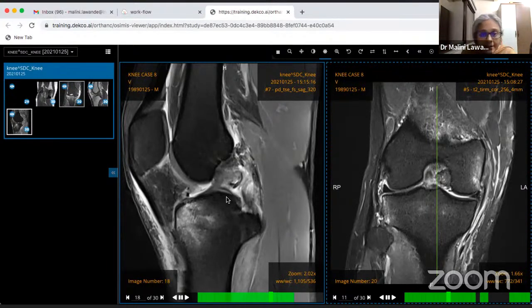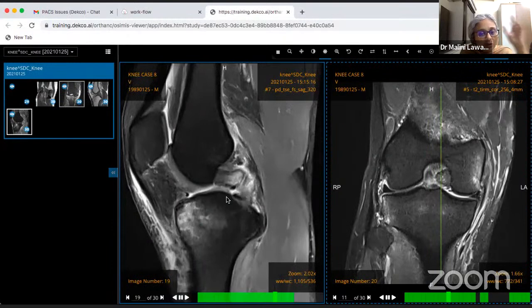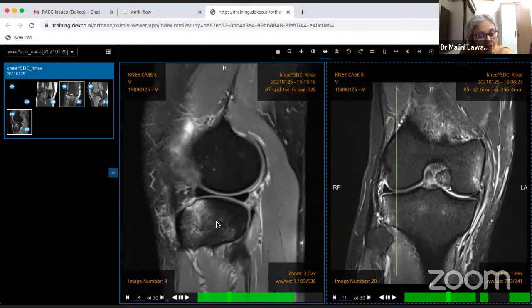So here, anterior, and in this patient with trauma, we know that this fits into dashboard injury. And in dashboard injury, we are typically looking for posterior cruciate ligament pathology. So that's how these marrow edema patterns help us know which structures to look at carefully. Also, the marrow edema can explain the pain, and depending on the amount of marrow edema, one may decide to operate after the marrow edema settles down.